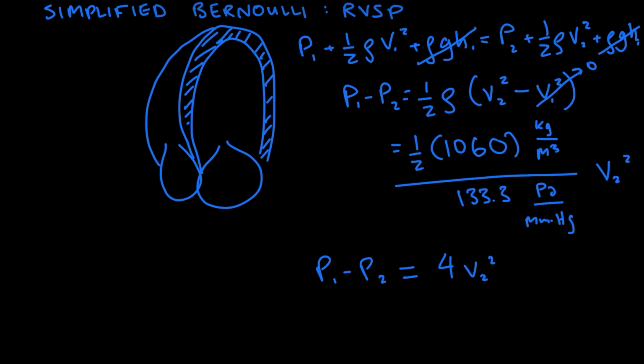What does that mean in terms of the heart? Well, let me go back to this apical four-chamber view, and we have a first point here. I'm going to call this the high pressure, pH. And we have a second point here, the low pressure. And we can measure the velocities right at that valve. So I'm going to put my Doppler tracing right there, and I'll get a graph that looks something like this.